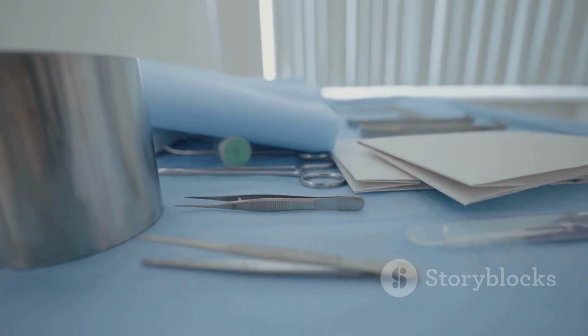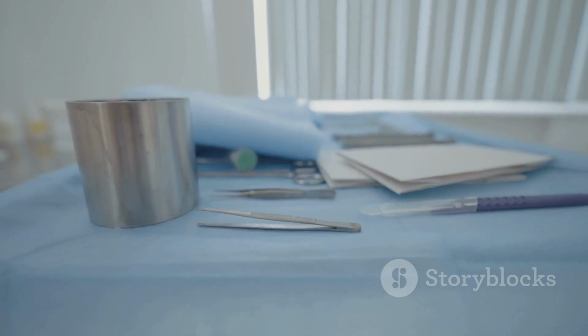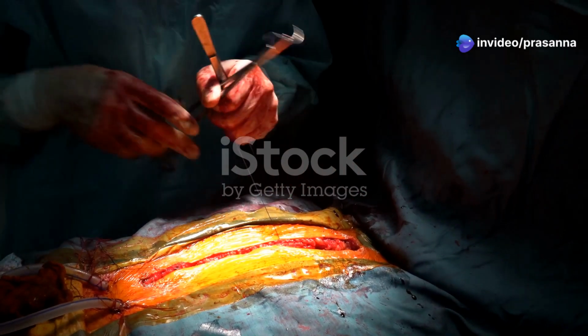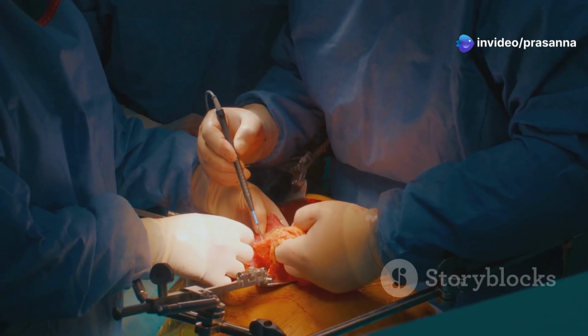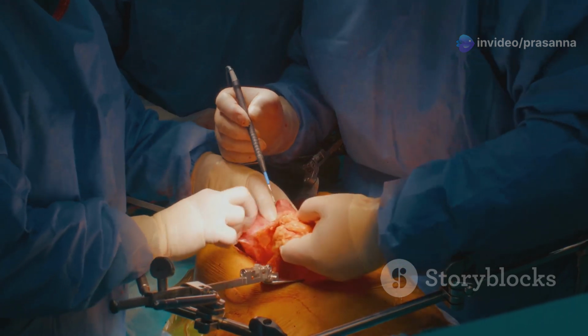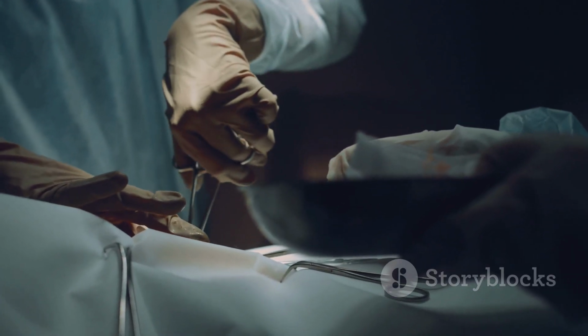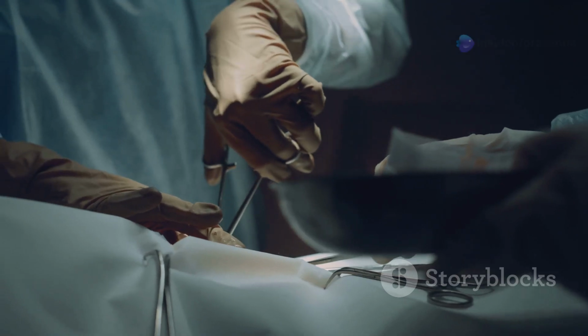One commonly used hemostat is the Halsted mosquito forceps, a small, delicate instrument used to clamp off tiny blood vessels. These forceps are especially useful in delicate procedures where precision is key. Think of them as miniature clothespins clamping down on small blood vessels to prevent bleeding.